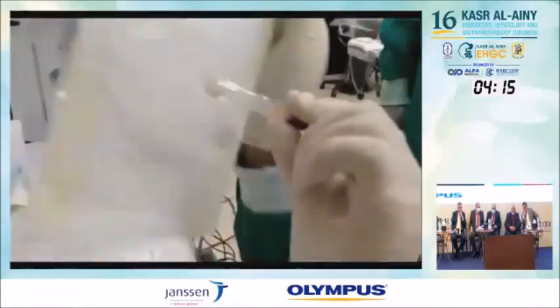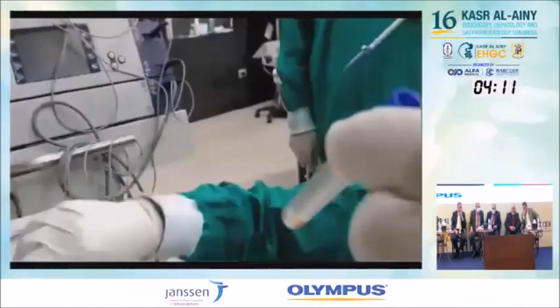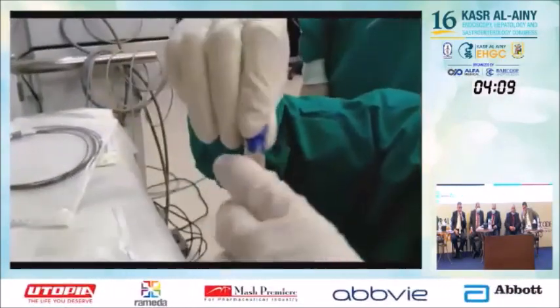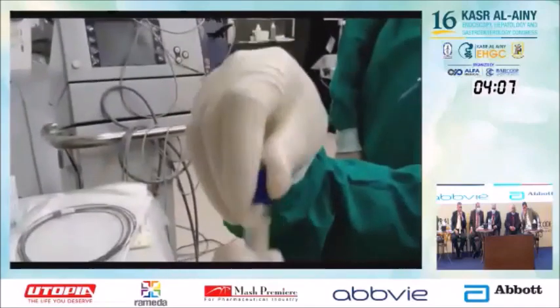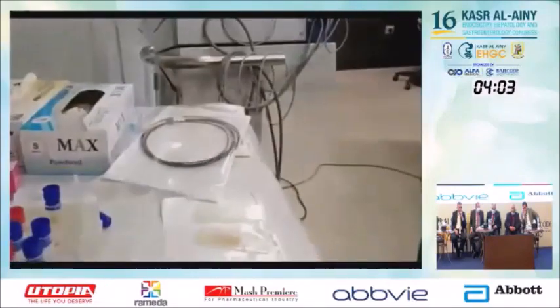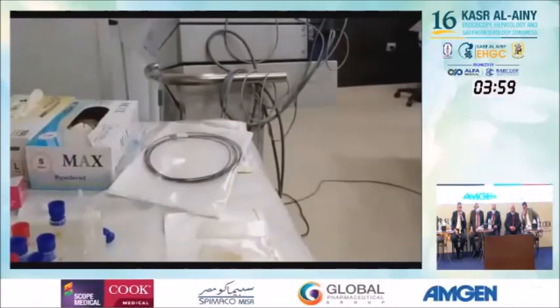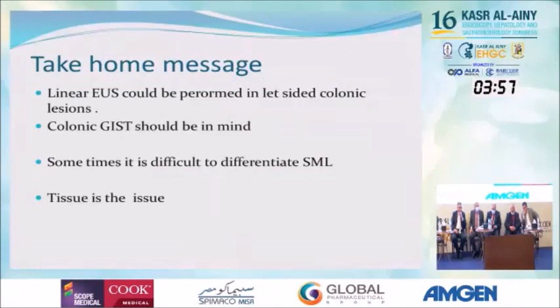After reviewing the literature, we found that some duplication cysts may have their fibrous wall continuous with the muscle layer of the stomach. That is why it gave us the impression of maybe a GIST, a gastrointestinal stromal tumor of the stomach.